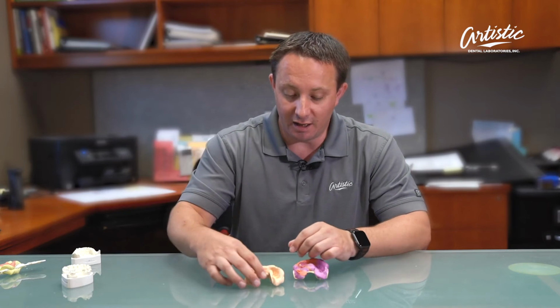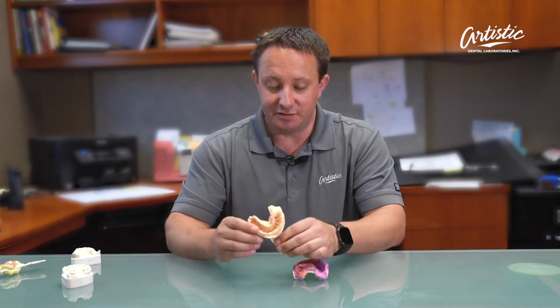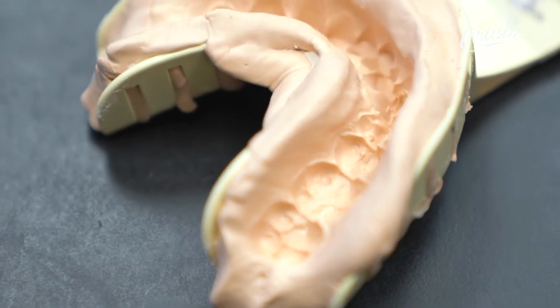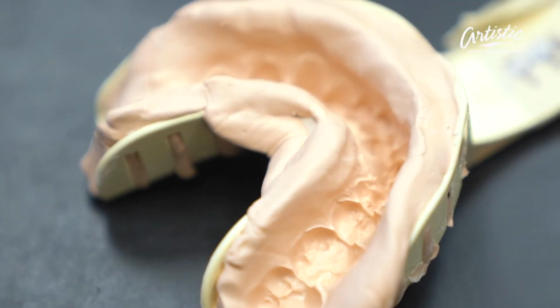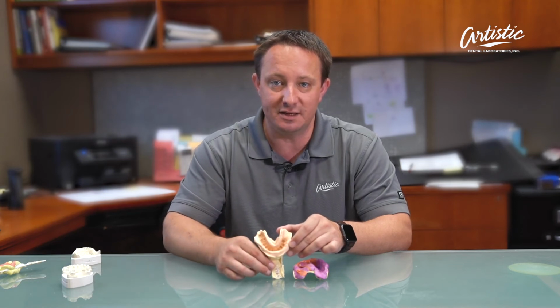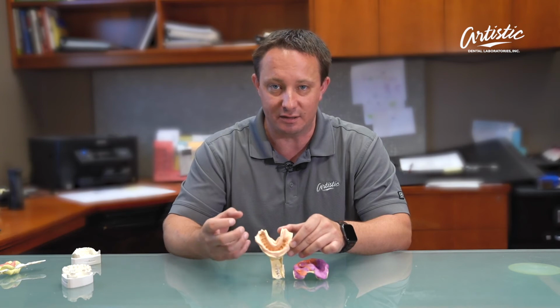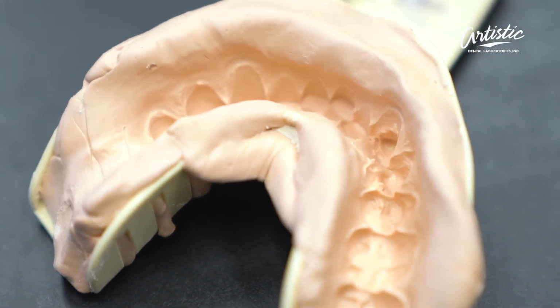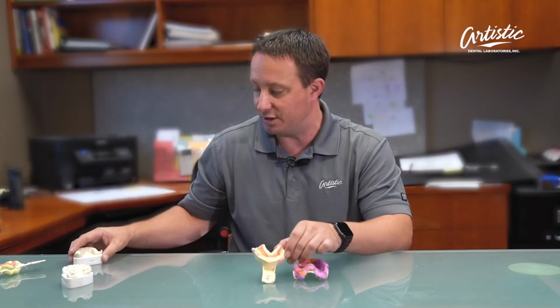Another very common problem that we have with these impressions is distortion. This distortion happened here, near the anterior region. This is an anterior region that's going to oppose another part of the restoration. So we're going to be making crowns that are opposing this, and we have an issue here where it looks like either the tray was moved in the mouth by the assistant or the patient let go and kind of rebit down during the impression taking technique. And that actually caused a double impression or a distortion in the impression.